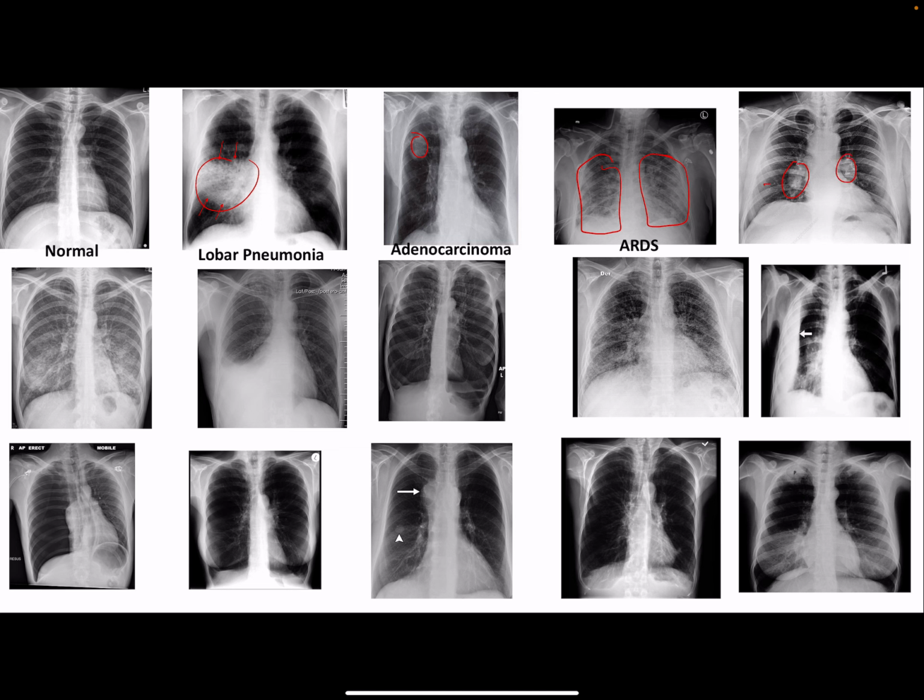I see kind of reticular formation, maybe sarcoidosis. Over here, let's say atypical pneumonia or pulmonary fibrosis. It's really hard to tell which one, so we'll go with either. Here we have a pleural effusion, which gravity has brought down. Here we have this large expanded rib cage. We have this flat diaphragm, and it's relatively radiotranslucent. This is emphysema.